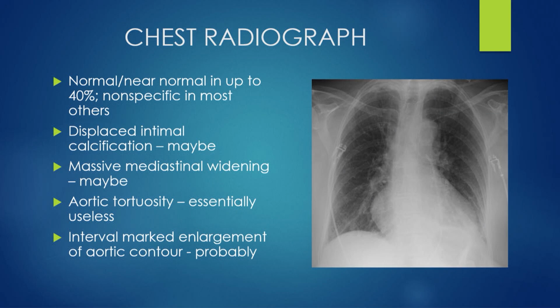All right, so the chest radiograph, I bring this up because in another life I do some expert testimony, and so this is a bugaboo in the ER. I have a very low threshold for calling aortas tortuous. If it's normal, yeah, that's fine. But otherwise, I'll say mild descending aortic ectasia, and that's just out of an abundance of caution.